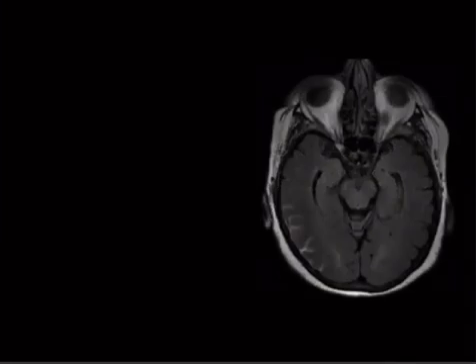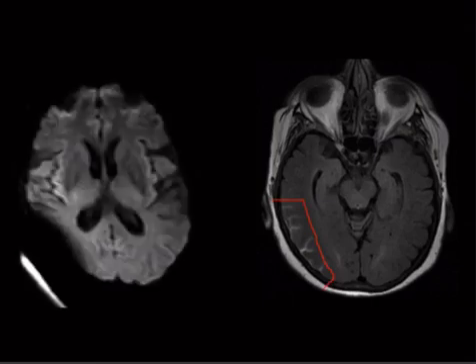Now, there are several artifacts or fake-outs that can make things look like subarachnoid hemorrhage on FLAIR, and I'm going to go over the ones that I think are most common. So here we've got what somebody might call subarachnoid hemorrhage right here, right? But if we look at the diffusion, we see there's some kind of artifact like you see with metal, like a valve, or the same kind of stuff you see with dental artifact.